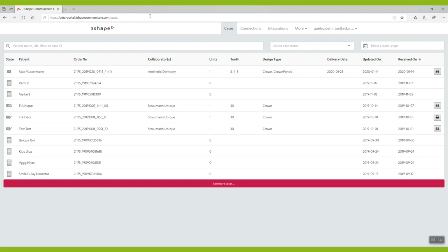of Central Production. Please also take note that the time starts to count upon case acceptance and not when the case is sent or opened by the case manager. If any information is missing or the scan is not of the requested quality, the case manager might ask you to send additional information before he can accept and start designing.